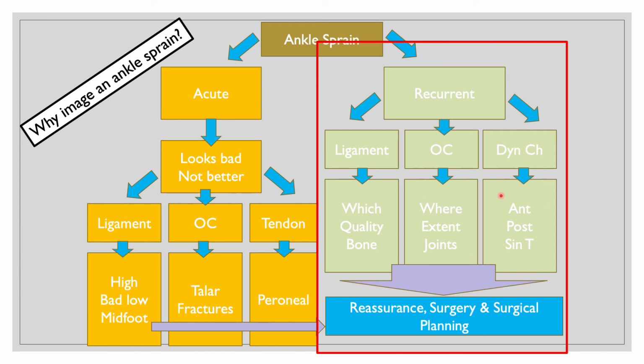And then we're looking at the dynamic changes from instability, which lead to bony outgrowths, synovial proliferation, or just exaggerated effects of accessory structures like the os trigonum or Stieda process, which can lead to impingement, upon either the neurovascular structures, the tendons, or actual bony impingement, and then finally involvement of the sinus tarsi also, which can happen.